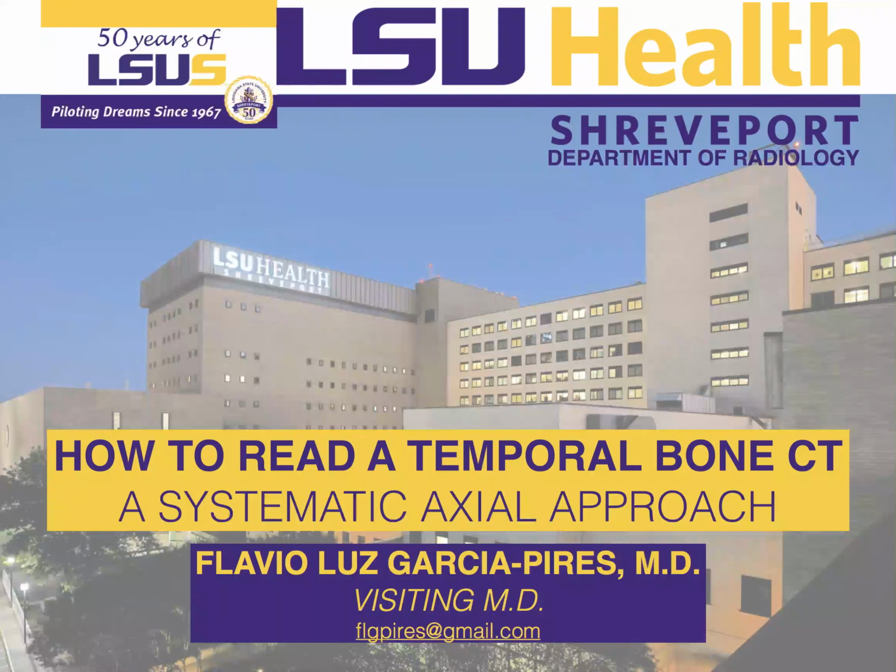Alright, good day people. I'm here to present this short lecture about the temporal bone. The title is How to Read a Temporal Bone CT. This is a systematic axial approach. My name is Garcia-Pires. I am a visiting medical doctor here at LSU Shreveport.